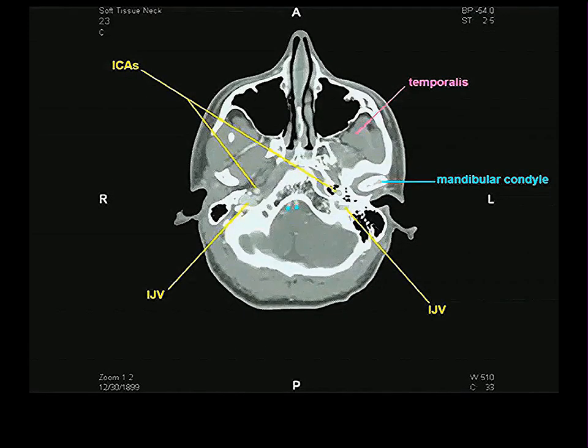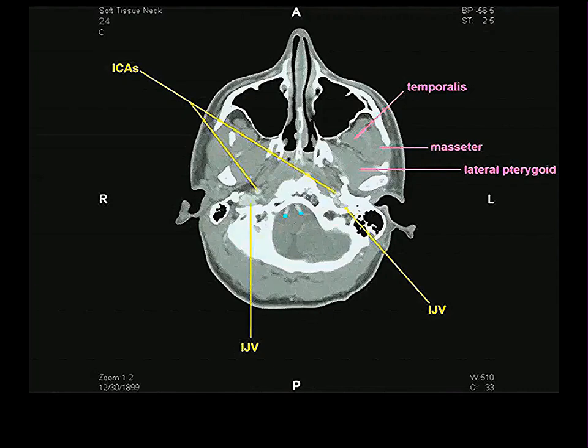We see the left internal carotid artery entering the carotid foramen of the skull. If I go down a level, we see the internal jugular vein exiting from the jugular foramen of the skull. Again, we're seeing things happening on the left side of this person that are different than on the right because these are oblique sections. I put little stars here.